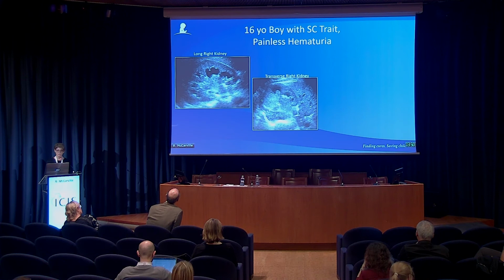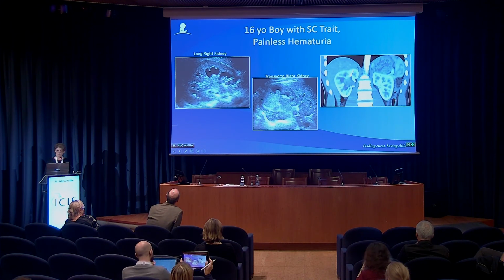This was a 16-year-old boy with sickle cell trait, presented with painless hematuria, had this centrally located solid mass. The central location is very common in these tumors. And by CT, you can see that the tumor is invading the renal pelvis and collecting system.